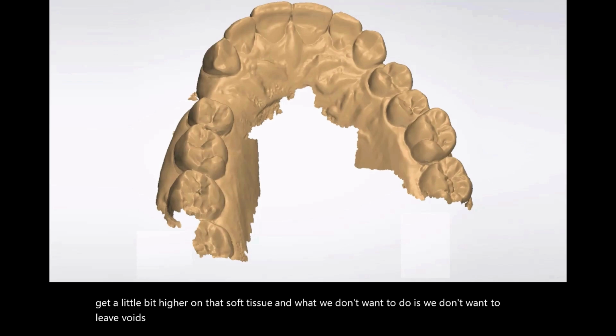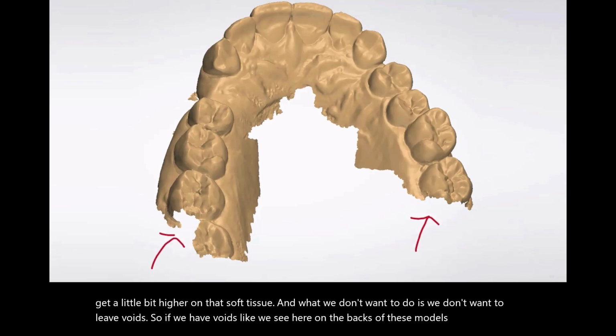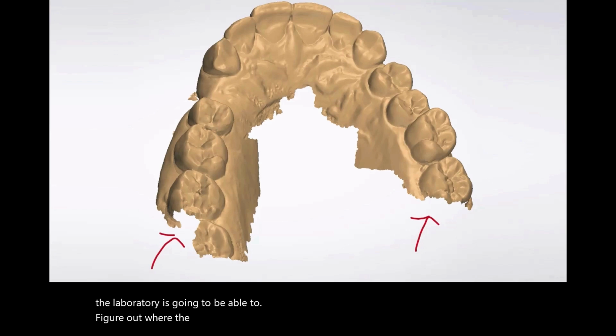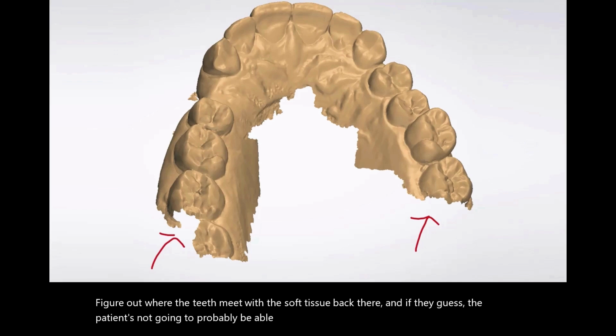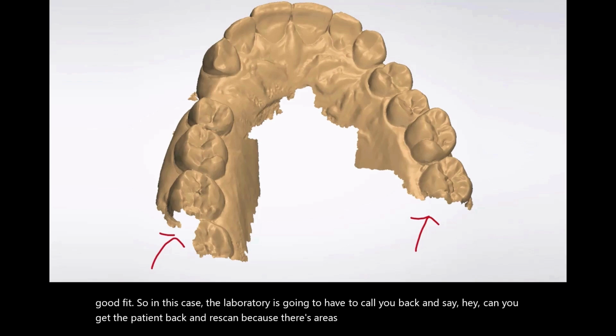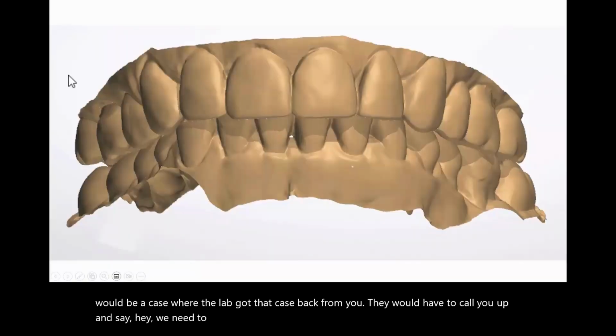So if we have voids like we see here on the backs of these models, there's no way the laboratory is going to be able to figure out where the teeth meet with the soft tissue back there. And if they guess, the patient's probably not going to be able to seat the tray down. We're not going to have a good fit. So in this case, the laboratory is going to have to call you back and say, hey, can you get the patient back and rescan, because there's areas of this intraoral scan where we're missing information.